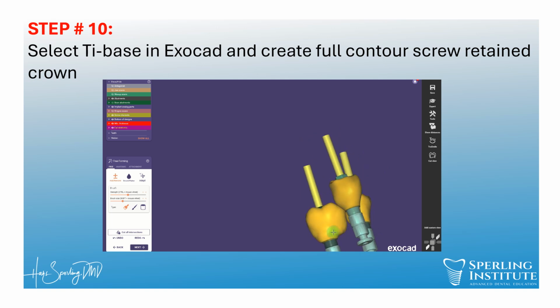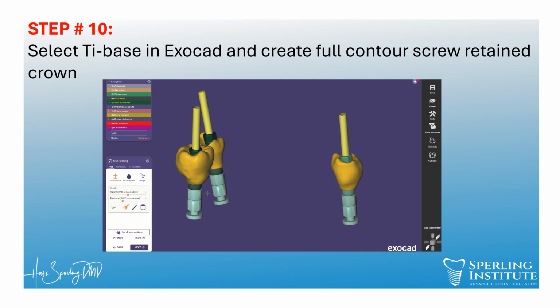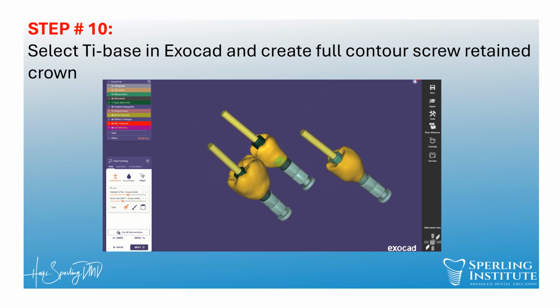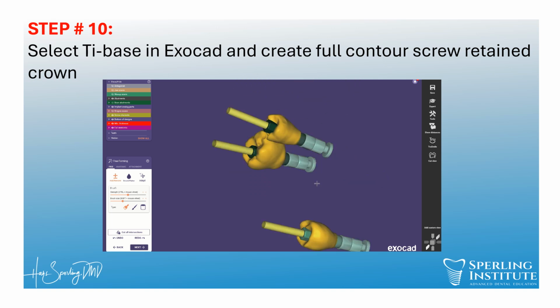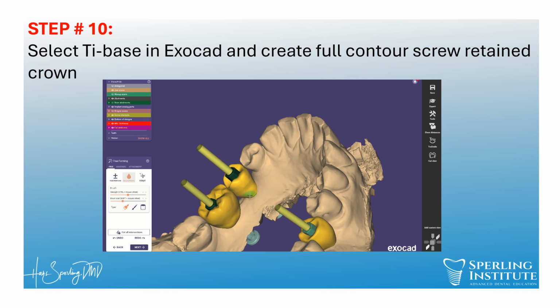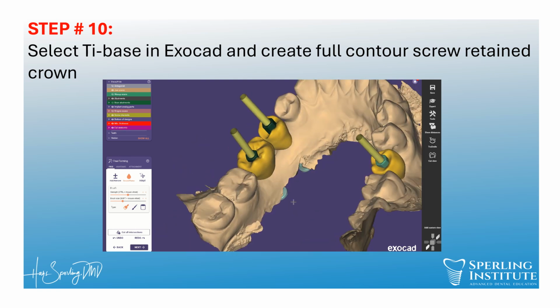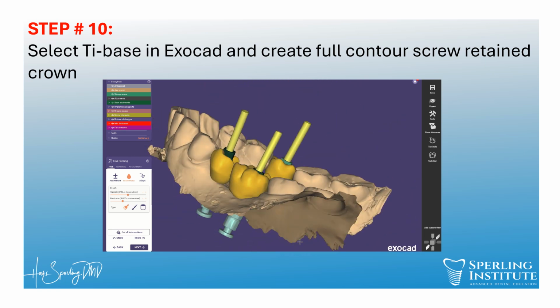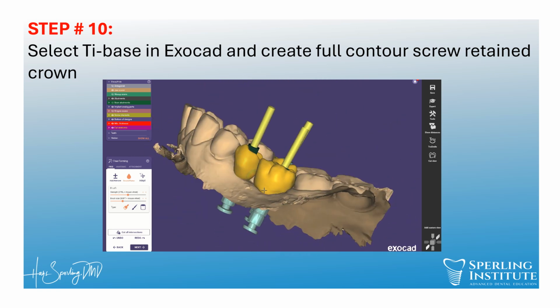we can go with a smaller healing collar here, not at 2 millimeter, but something smaller. And that will allow us to make for a smoother transition. Let's see how this turns out. So this is how I always adapt my crowns. It's much easier to do it this way than to go directly from the crown, implant crown module. It's much easier to do it this way.